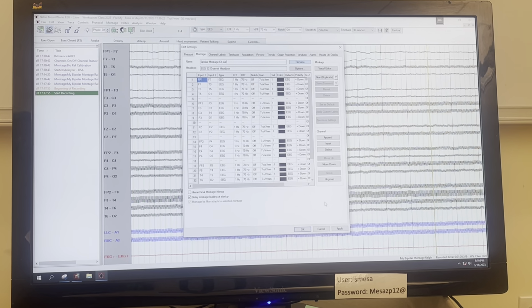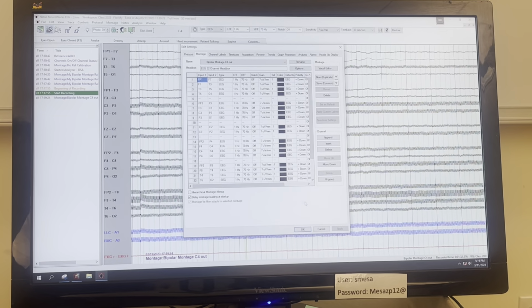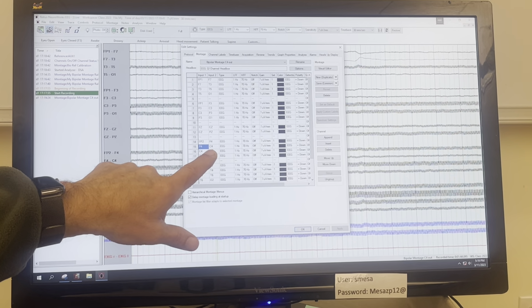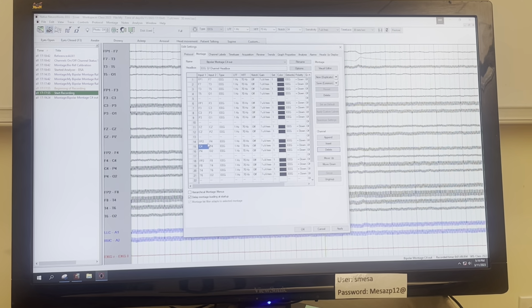And then you hit apply. Now your new montage is right here, bipolar C4 out. So now we have to take out C4, because C4 is not working, since it's not even on. So you come over here, click on the channel with C4, and hit delete. So it takes out that F4 to C4 derivation. And then here's the C4 to P4 derivation.